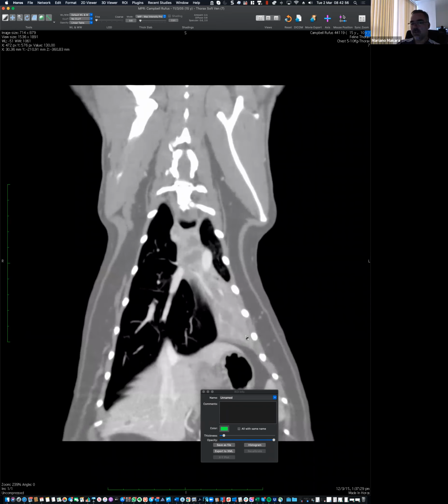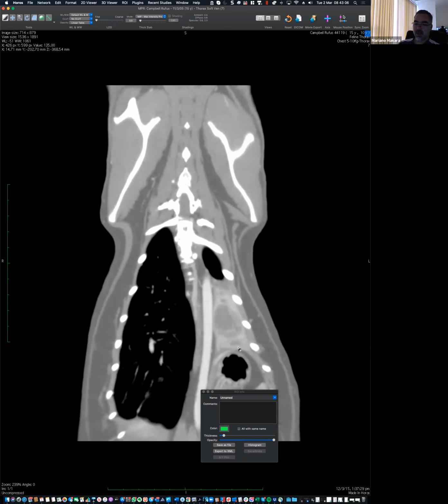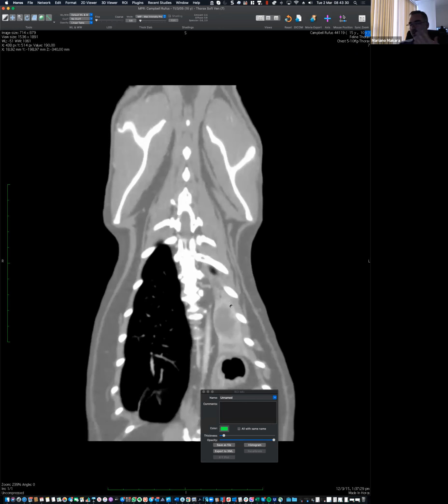And by doing this, it obstructs the airway, and there's also bleeding. And that's why in a dog, we will probably have gas around that mass. And then basically we would see what we call a mass, like a soft tissue structure surrounded by gas. In this case, the mass is surrounded by either atelectatic lung or lung with fluid. Make sense? And therefore, we don't see the border of the mass. We just see that lung lobe that is not aerated, usually small, like in our case, or normal in size.